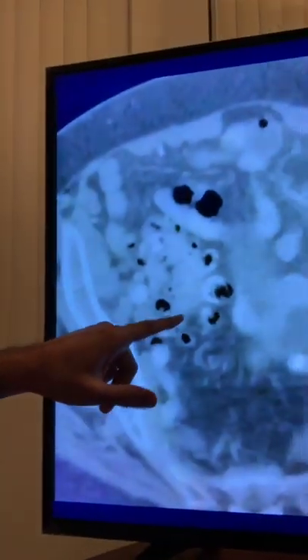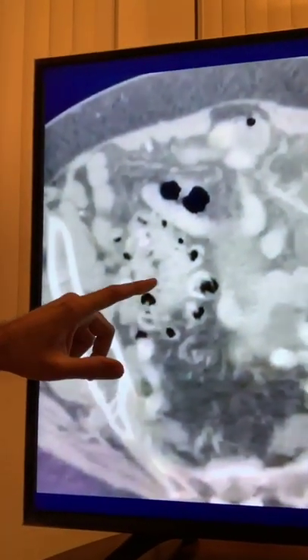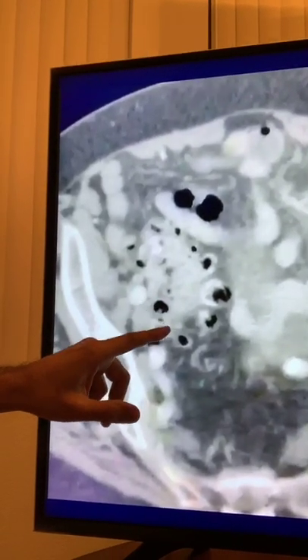Please tell me from yesterday's talk, how do you check for free air on a CT image? You don't just scroll through on this window. This is not the window that you check for free air. Yes, you can find free air, but it won't be as obvious to you. So you look at the lung window, just like you're going to look at the lung parenchyma and everything gets all whited out. You use that window and then you scroll down into the CT and check for the free air. Free air is not just flagrant air rising to the top of the abdomen. Sometimes it can be just little specks here and there, but that's all the surgeon needs to know to tip them off that this thing has actually perforated. So perforation is the main one.